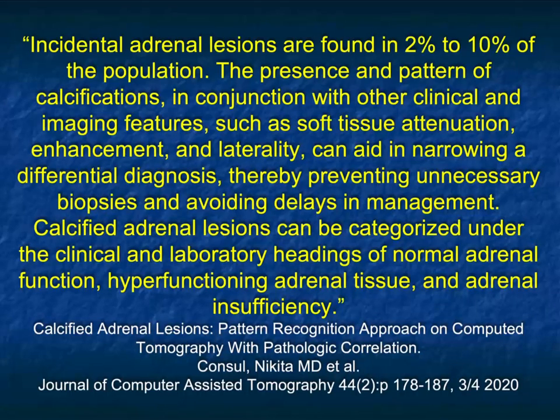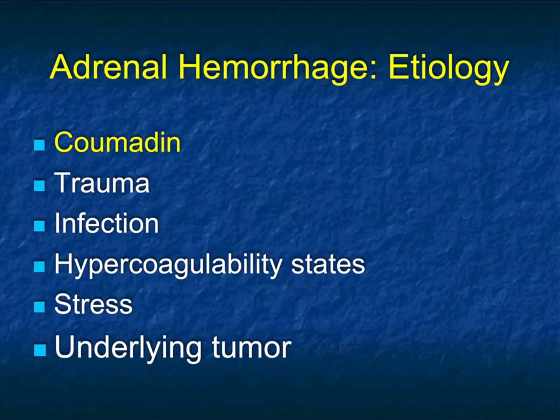The challenge is, how do you be specific? And I think from a clinical perspective, the answer is surgery versus no surgery. And so can I help make the correct answer? So that becomes very, very important. So let's look a little bit more specific.